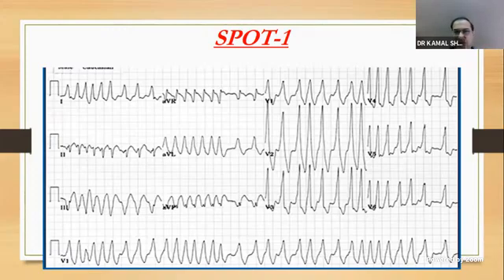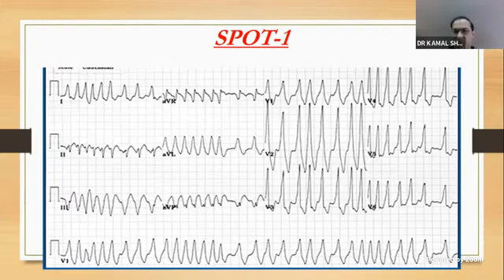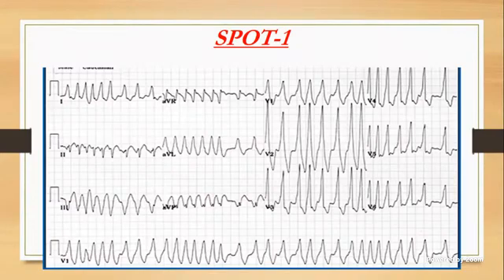And what is the conduction, and as Professor Greaves was saying, look at what pattern. Sir, he's already given you a clue. Long follows short, sir, then there will be the RBBB pattern. When a long follows short, there'll be RBBB pattern due to the longer refractory period of the right bundle branch. So why is it always when a long follows short, or why would you get it then? Because of the refractory period. Or is it short follows long?